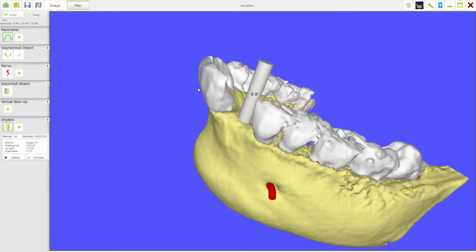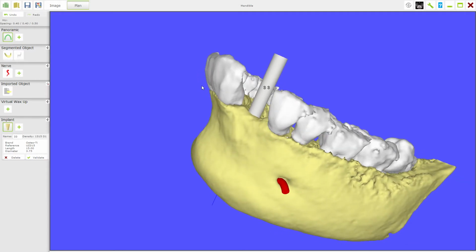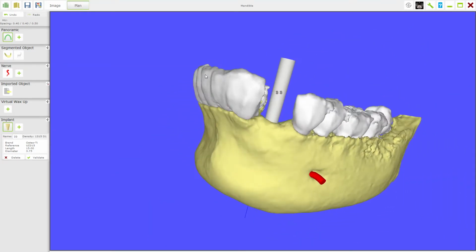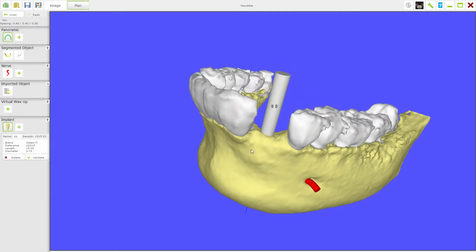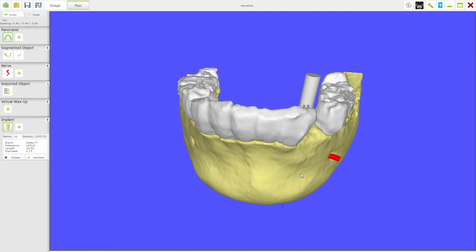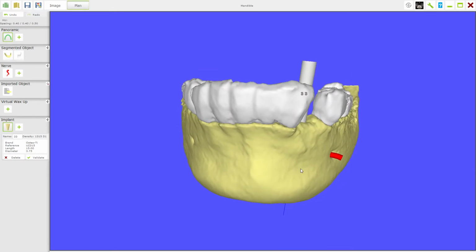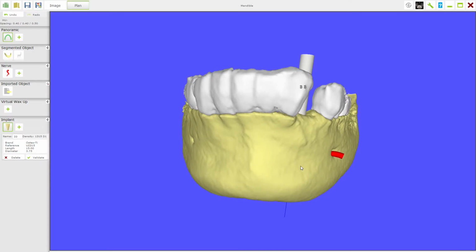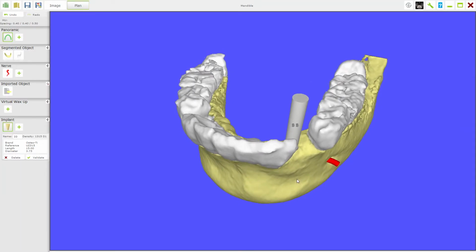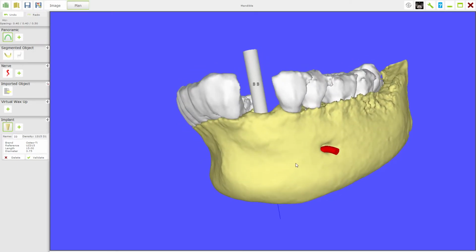Now, could anybody or any implantologist play with this degree of positioning freehand? It'd be very difficult. You've raised the flap. It'd be very difficult to position an implant this precisely. As you become more skilled, you lift the flap, you get to feel the bone, you get an understanding of the three-dimensional shape of the bone, and you can do this freehand, and many surgeons do this freehand because they can assess the bone visually. But you can imagine if you're a novice and you haven't placed many implants, then to be able to position it like this, lifting a flap, the patient's bleeding, they're jumping around, you've got this anatomy to worry about, you've got to consider your angles.